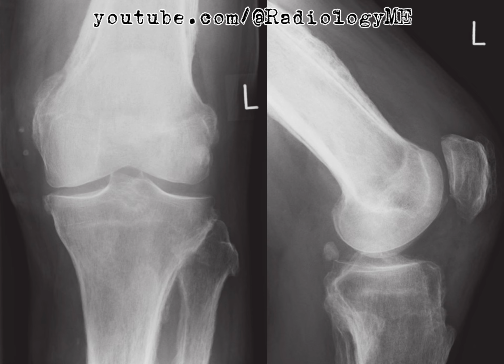In conclusion, based on the bilateral nature of the periosteal reaction, its distribution, and the findings on bone scintigraphy, hypertrophic pulmonary osteoarthropathy, HPOA, is the leading diagnosis. Further imaging, particularly of the chest, would be critical in confirming any underlying pulmonary pathology, most commonly bronchogenic carcinoma.